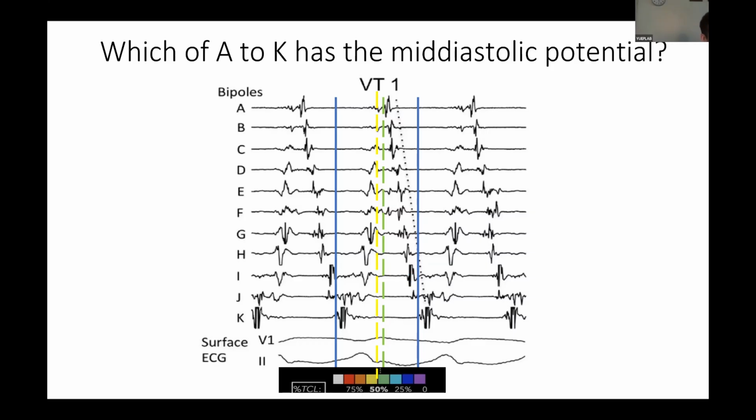So the only sites we call the diastolic component will be, as I mentioned, the yellow part and also the green part. So this part is actually located at the end of QRS, as I mentioned, right? When your cycle length is slow and the QRS is wide, you try to pace, you will get a relatively long stimulus to your QRS.